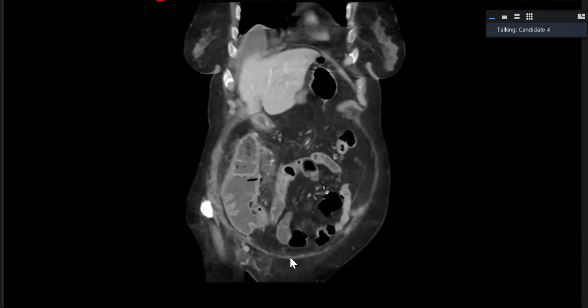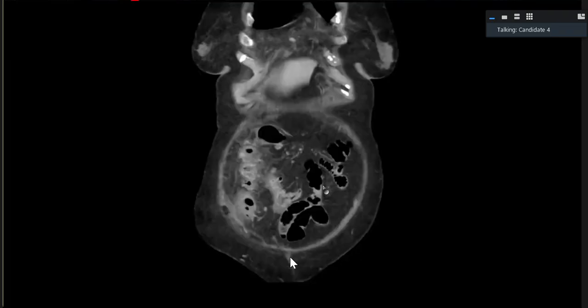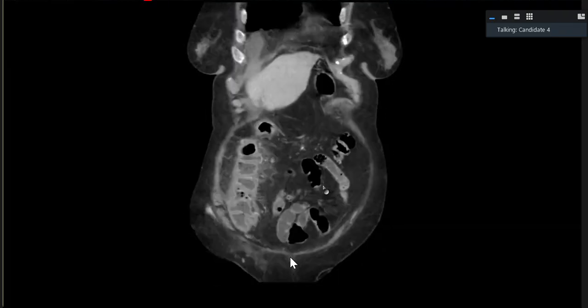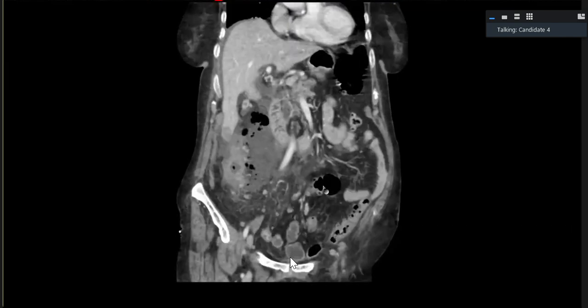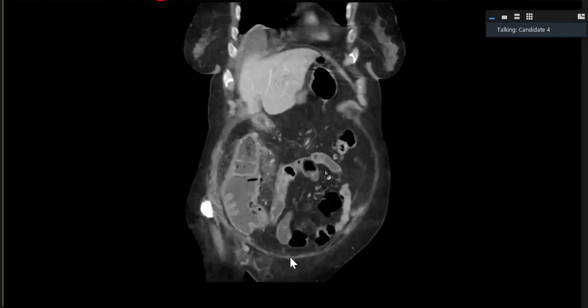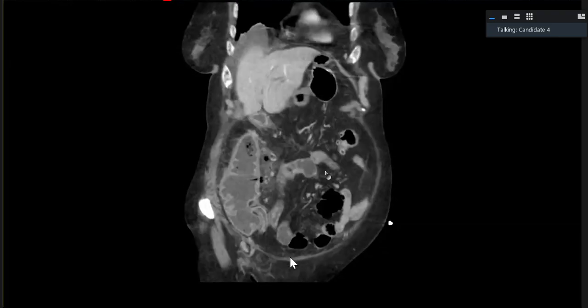Okay. There is a multiple incidental finding of multiple diverticulosis, which is involving the transverse colon, and few diverticula are also seen in the ascending colon. And there is marked thickening of the ascending colon and the cecum with enhancing walls. Terminal ileum is also slightly swollen and thickened.